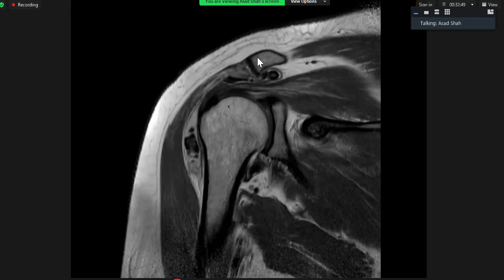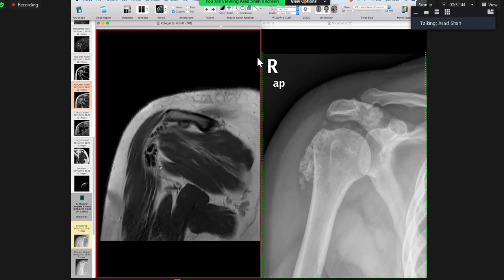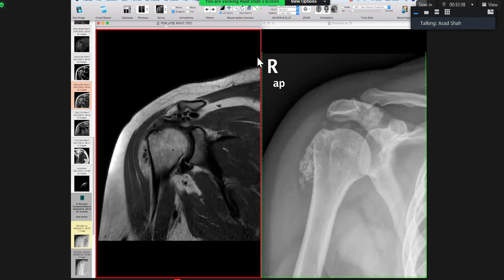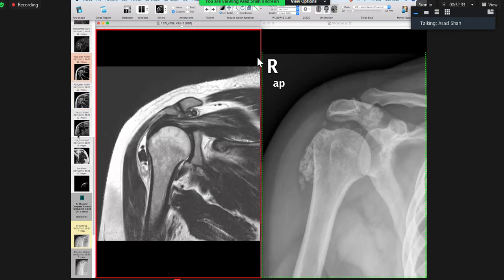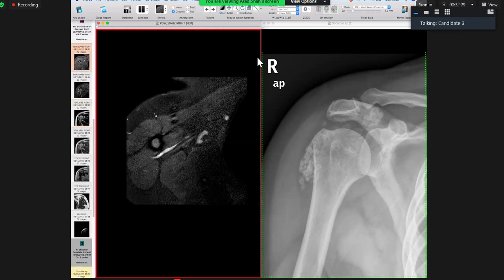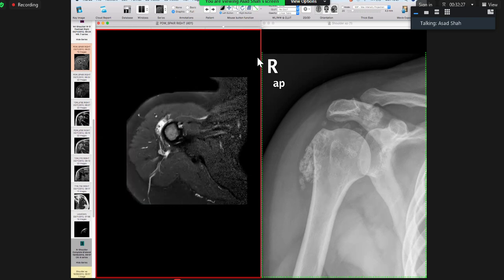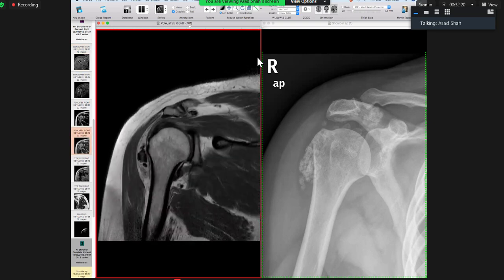That's fine. Because they're well defined, numerous, of variable size, well-defined osteochondral bodies with a relatively preserved joint space. You can have it even in an adventitial bursa as well. This is a large bursa with synovial metaplasia. So this is synovial osteochondromatosis in the bursa. That's all.